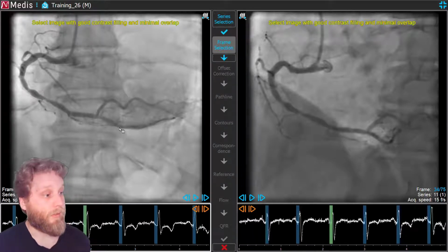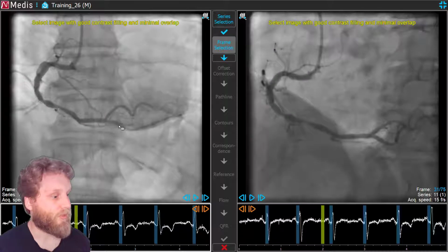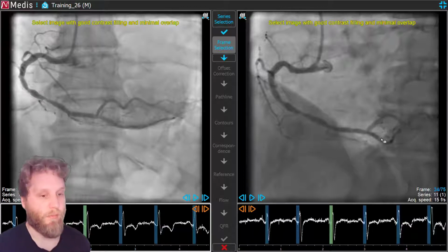On the right coronary, there's also an added benefit of having the distal bifurcation. You will notice its angle increase at the moment of end diastolic frame. So when we go to earlier frames, there's a slightly more acute angle between the 2 distal branches. Once we reach the end diastolic frame, which is the next frame, you'll see it start to open up to a more obtuse angle. Once you see this first opening of the angulation, that is the end diastolic frame.